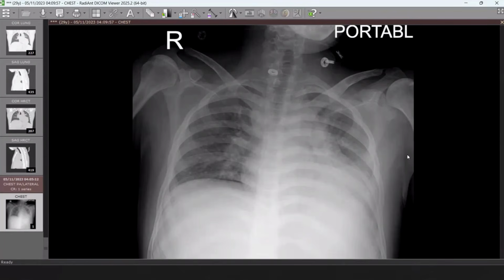I think in the left bronchus there is an abrupt caliber change. Can you please focus again on the left side?